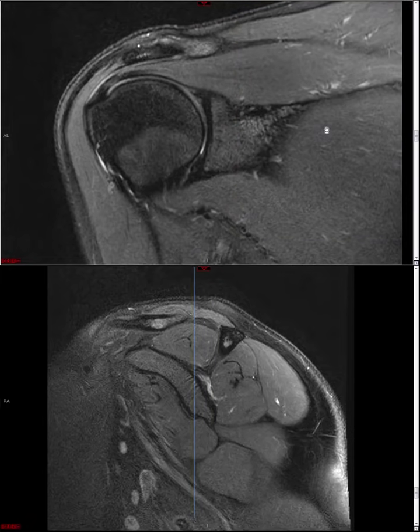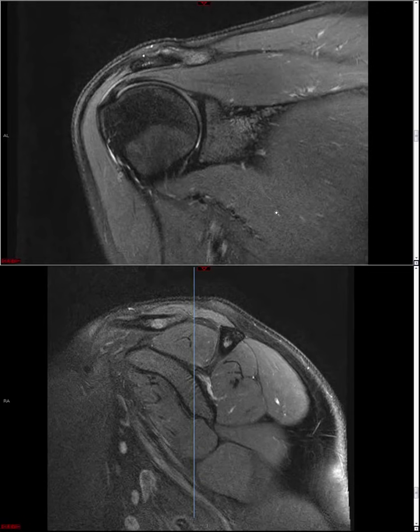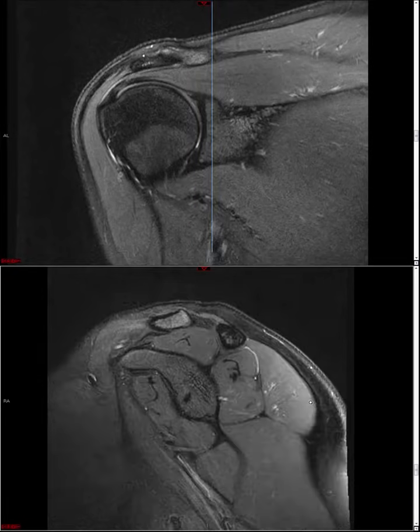I tend to rely more heavily on how much marbling, fatty infiltration of the muscle there is rather than the overall bulk, although if you're careful and you look at bulk on both sequences, you can use bulk as well to help you. Alright.